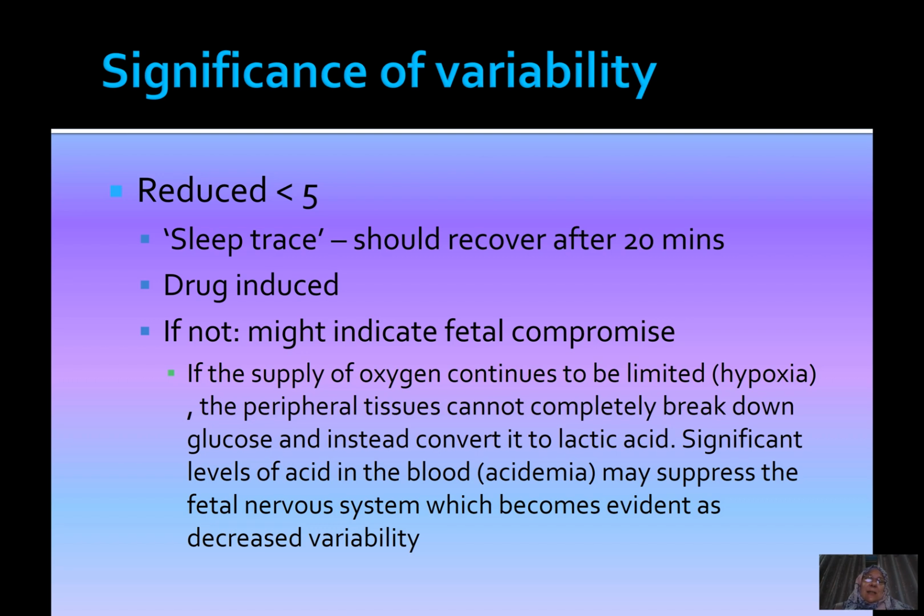However, it is typical when we see such a sleep trace that it should recover after 20 minutes, and if it does not recover after 20 minutes, typically you wait until 40 minutes and see if it recovers. You can give some stimulation to the mother, such as a cold drink, to make it recover and stimulate the parasympathetic nervous system. But if there's no sign of recovery after 40 minutes, this is a serious finding, and some action has to be taken.